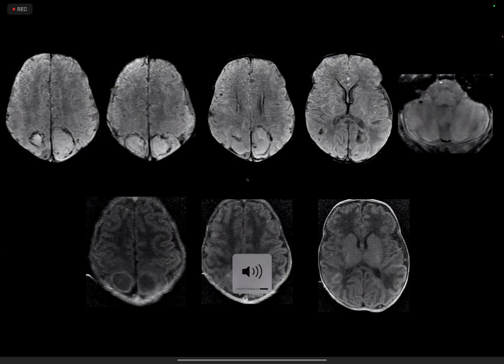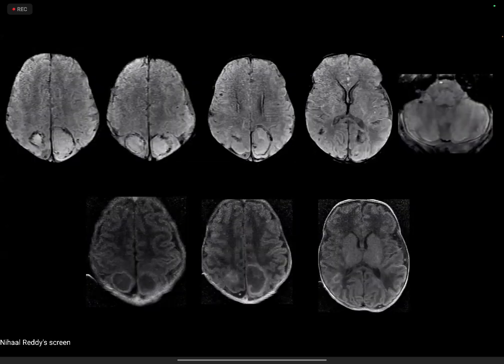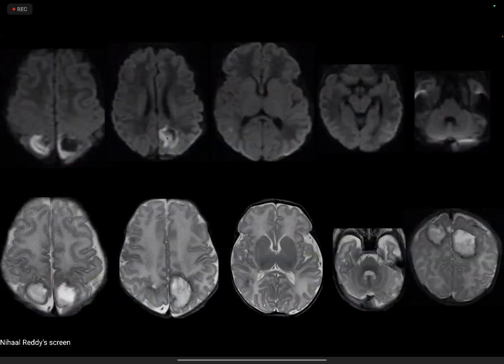In a pure hematoma, only the margins will remain, the periphery only. So inside the cavity, whatever you are seeing as those diffusion restricted areas, the internal margins also may enhance, sometimes in fungal. But if it enhances inside, it is not a hematoma. Outside anyway is going to enhance.